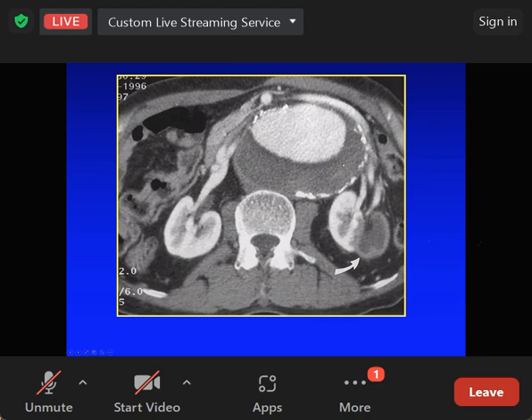It's quite common for this blood clot to develop interstices where the flowing blood can get through, and it's not at risk of aortic rupture. Obviously, the size of this means that this aneurysm is at risk of aortic rupture, but dissection through the mural thrombus is not an important sign.